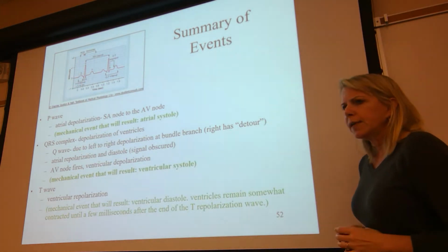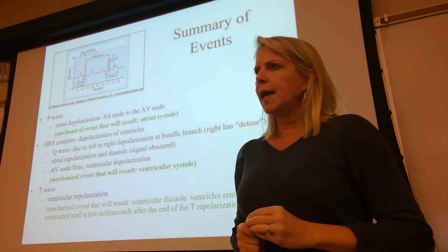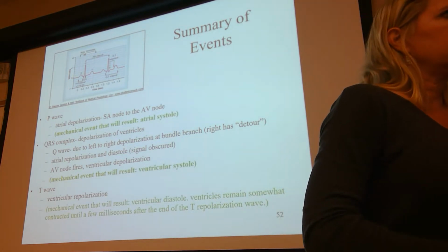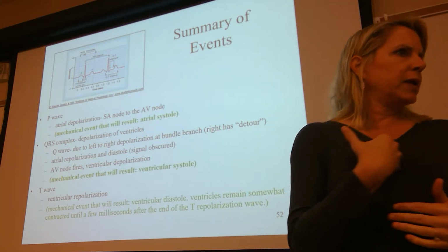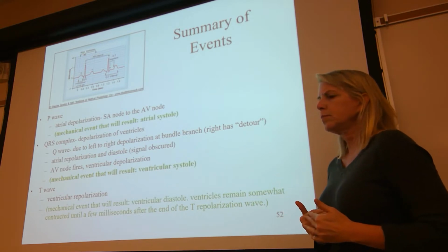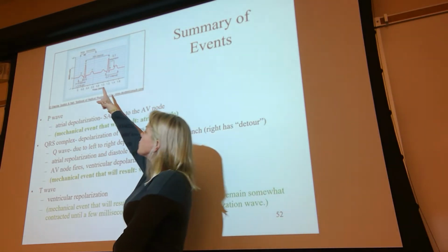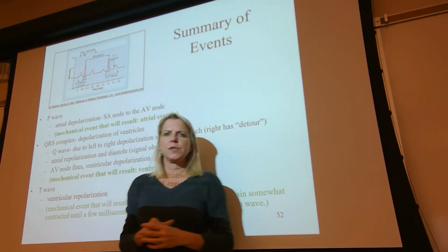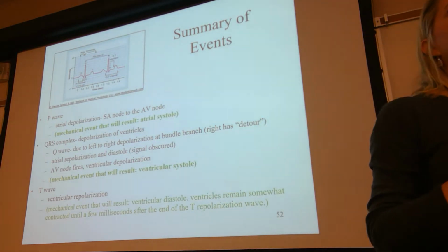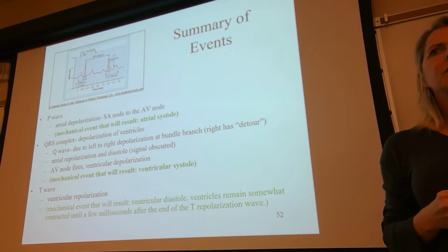On your EKG exam, it will be your responsibility to understand the different waves, intervals, and segments. My job is to explain to you right now what those things mean. We recognize that the picture up on the screen where you see the P wave, QRS, and T is the typical perspective from lead 2.